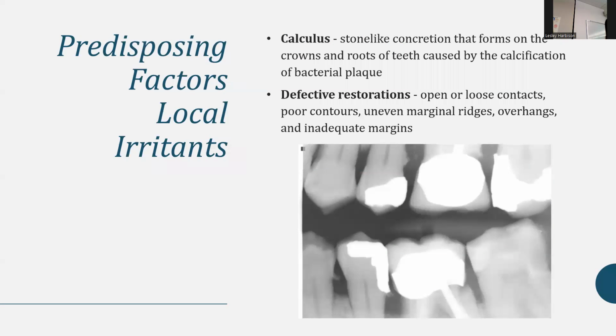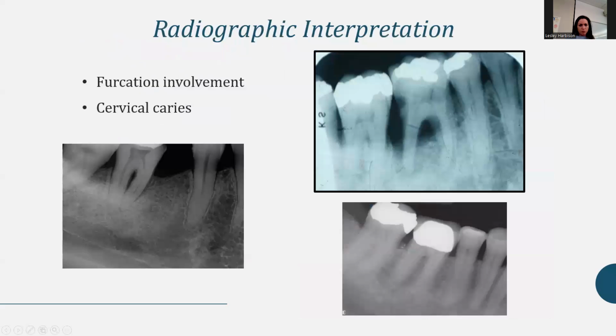Yes, for slide 24, the top picture for the first and second molar, is that horizontal or vertical? This one between here and here, because the CEJ, there's decay here, but the CEJ is here, and the bone loss kind of goes the opposite.